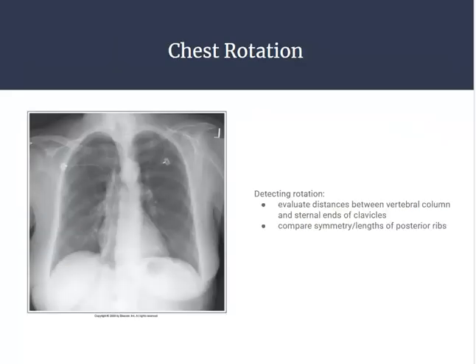It's important to recognize rotation on a PA projection of the chest. The reason it's important is that on a rotated PA chest projection, rotation tends to demonstrate distortion within the mediastinal structures, and it creates an uneven brightness between the lateral borders of the chest. Therefore, you want to ensure that the mid-coronal plane is parallel with the IR so that we can decrease this distortion.